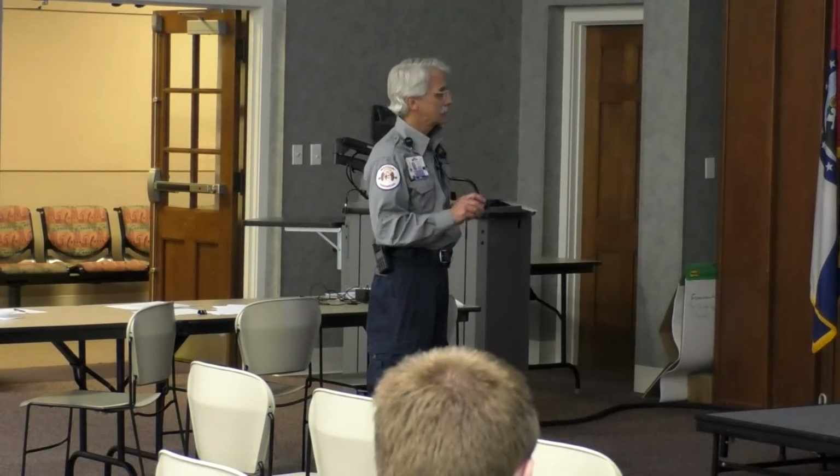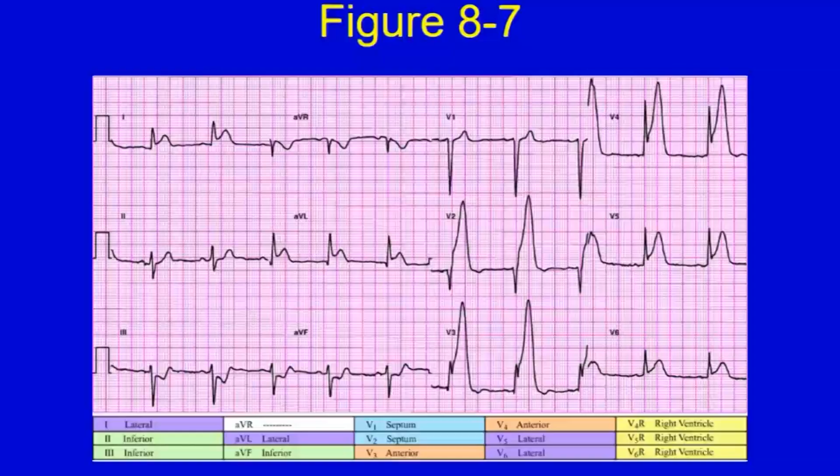All right? What leads have elevation? V2 through 6, 1, AVL.